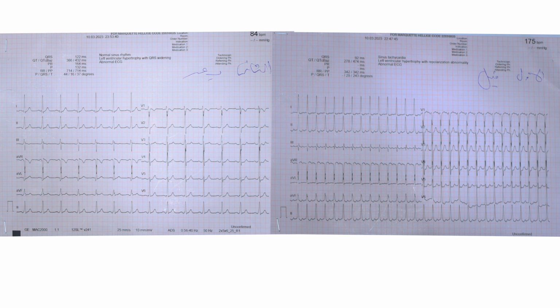We compared this ECG to the ECG of the supraventricular tachycardia, and if you look at AVL, the negative delta wave became positive, and the QRS complex in the chest leads is the same as in pre-excitation. So this morning we were thinking this is not an anteroseptal accessory pathway. This could be a left lateral accessory pathway far away, so that the pre-excitation is not seen, and this is seen in young age because of enhanced AV nodal conduction.